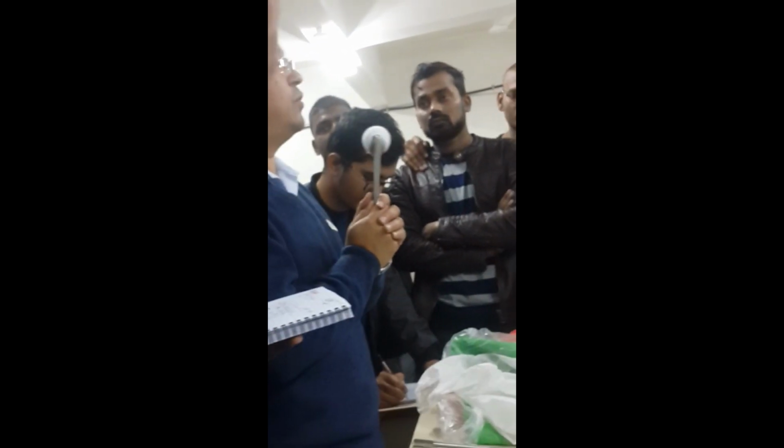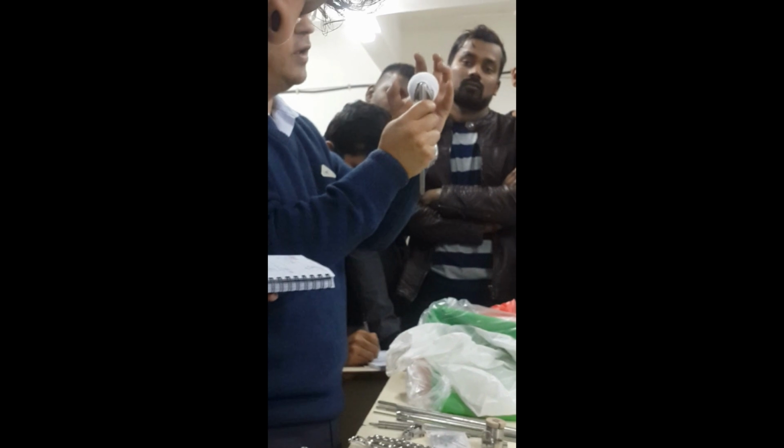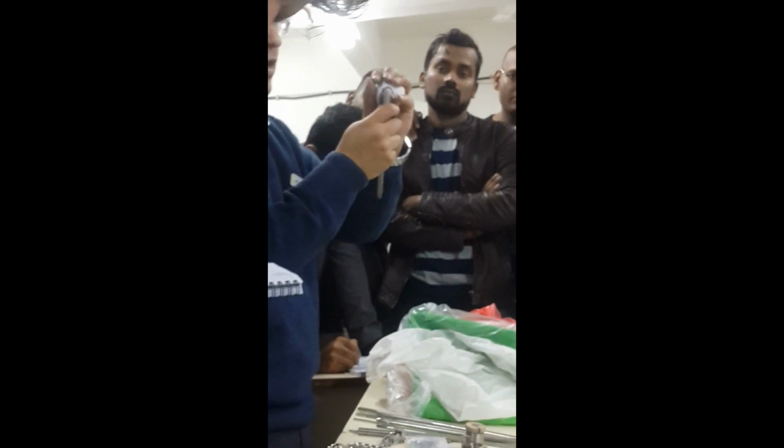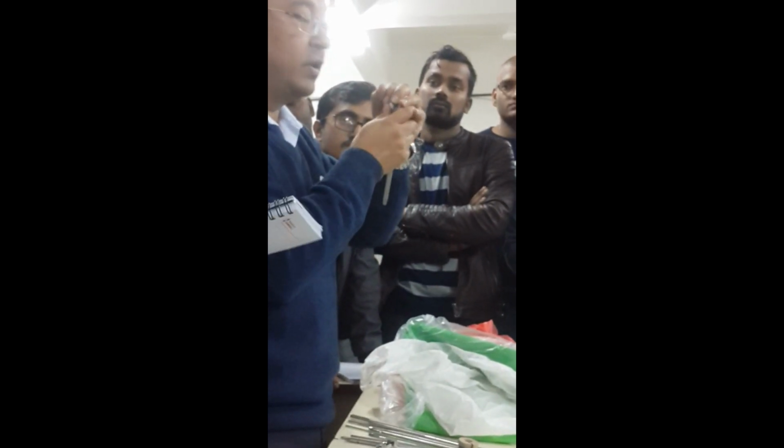And there is another one known as the bipolar prosthesis. In bipolar, the head is always there, and over the head there is another cup-like component, and it just rotates. Okay. And you just put it inside. We don't touch the acetabulum. If you touch the acetabulum and put a cup there, that is a total hip replacement. You have to replace the acetabulum, put a cup there, and put the femoral head and stem, and that becomes a total hip. Now this is just a partial hip, or hemiarthroplasty.